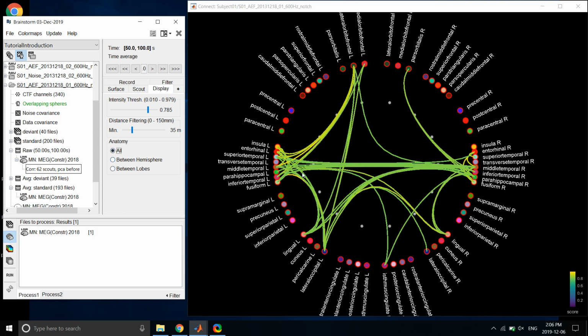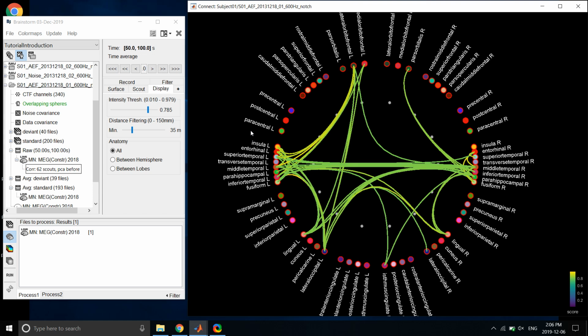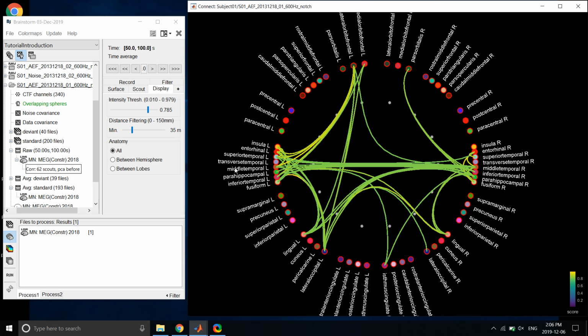And so there are many ways also to play around with this graph. You can select a specific node using these little dots in the middle here. So now I'm only showing connections that are relevant to this node. And now I'm showing all the connections. You can also select a specific region. Now I'm only showing connections that connect this specific region, and so on and so forth. So once again, this is maybe a better way than the connectivity matrix to go through and explore your data.